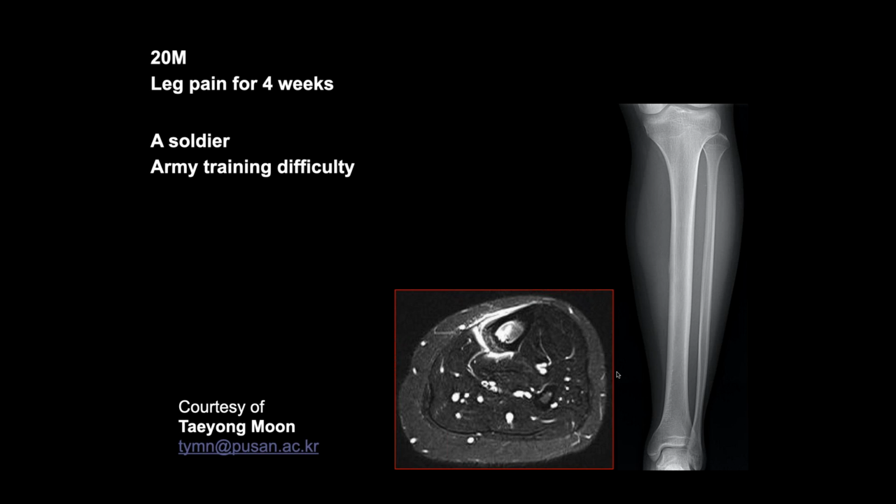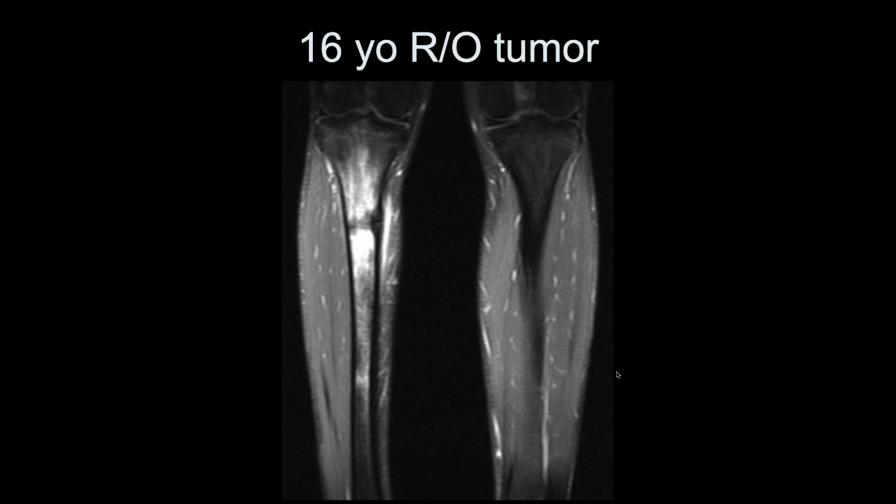With that last case, since you had that transverse fracture, do you also give the other Ewing's and adamantinoma? Yeah, you have to, because you can get stress fractures in abnormal bone. So you can get stress fractures associated with Ewing's and adamantinomas, as well as fibrous dysplasia. So just because you have a stress fracture doesn't rule out the other diseases. So you have to consider them.